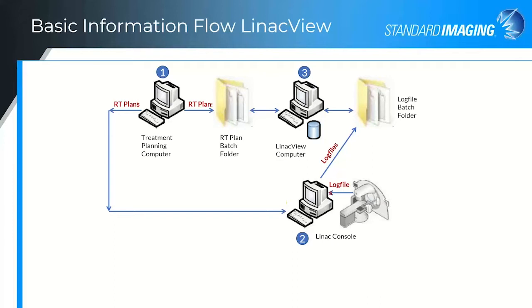So with that, let's discuss log files a bit further, but I wanted to start with the basic workflow. The RT plan, of course, going to LinacView, getting delivered, and then the log files are also collected in LinacView. So there's a syncing mechanism here into LinacView, and all the analysis occurs here.